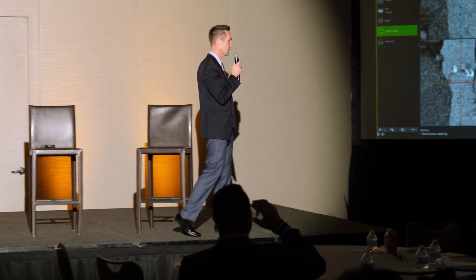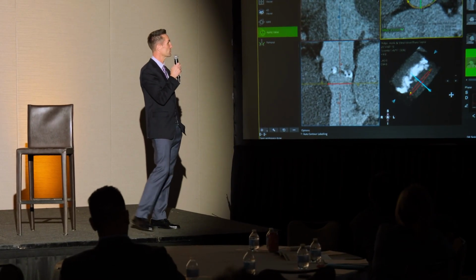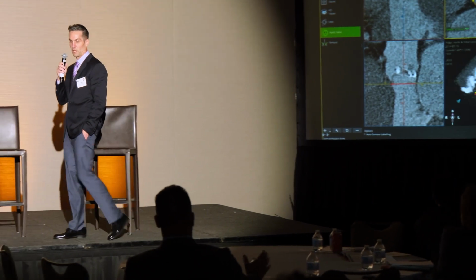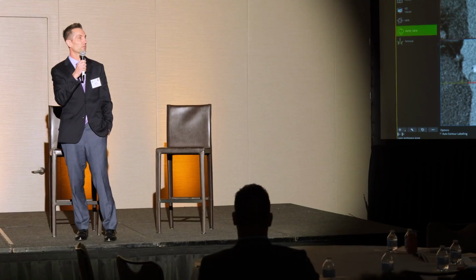And then we have MRI, right? This is all one seamless system. So as you move into an advanced imaging lab, you can process both coronary CTA or cardiac CTA and all the structural work, as well as the MRI. And Patrick, can we go back to the curved planar reformats?